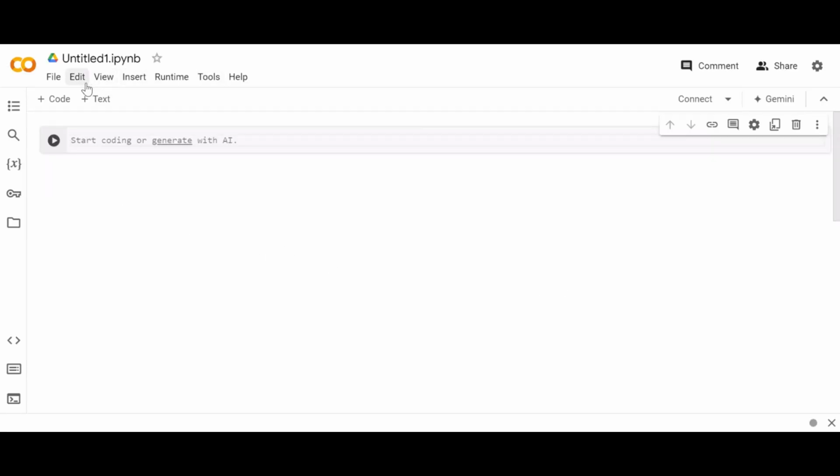So what I'm going to do first is give my project a name because it is based on pneumonia. So I will name this randomly like this, or you can name it whatever.